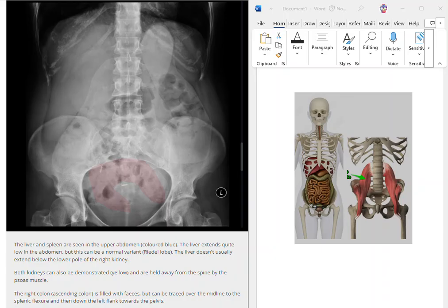I also want to talk about the psoas muscle, which is very important on our x-rays. If you look at the drawings out to the side of the x-ray, you'll see an x-ray of a full skeleton that shows you the large intestines, the liver, the part of the stomach, and the small intestines, and then the bladder down near the symphysis pubis, which, remember, is in line with the greater trochanters of the femur down there. So if you can look at those structures, put into perspective where they sit in the abdomen. Look at that big fat liver up underneath the ribs there on the right. The majority of the liver lays on the right.